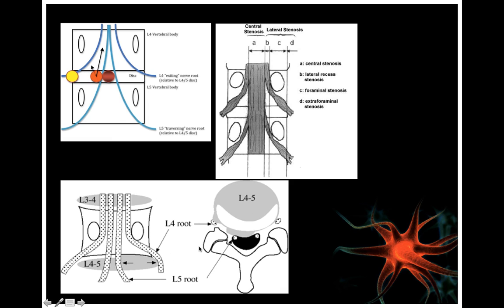And if you look at the axial view of the MRI, this is looking at from the front or from the back. So you have the central canal, okay? Remember, this is the L4 vertebral body. This is L4-5 disc. The one above is L3-4 disc. The L5 vertebral body would be down here. Through the middle, you have the L5 nerve going. L4 nerve is exiting, so it's in the exiting lane. And this is the exit, and this is outside the exit, okay?